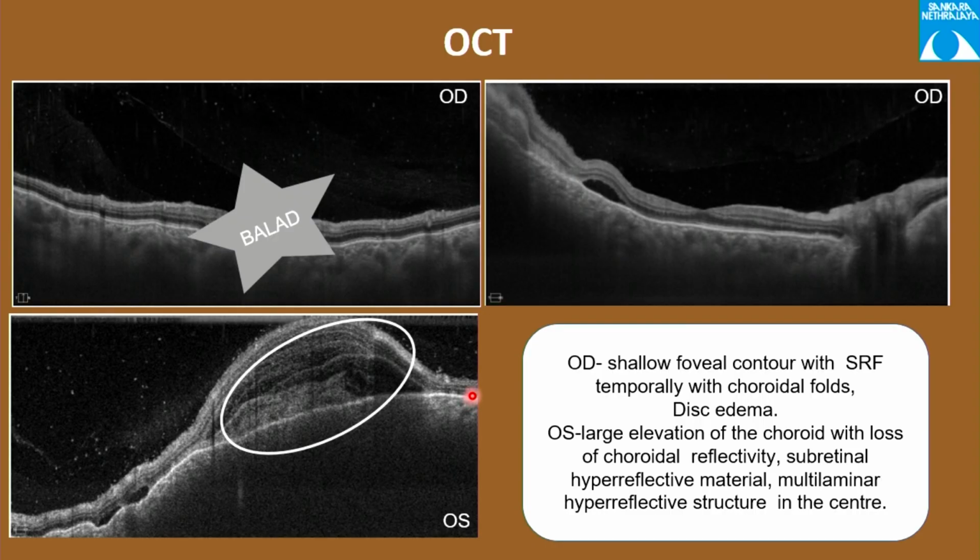Yes, ma'am. So initially I was telling you, whenever you have a choroidal lesion, you can also look at the OCT into the vitreous echo. See how this vitreous is appearing, and also how the neurosensory retina is looking. From that you can get a clue whether you're dealing with an infective inflammatory or an infiltrative pathology. And one more thing I would like to point out: if your neurosensory retina was normal, compact, but you still had this bumpy RPE, or the choroid was undulating like this, one other differential you must think of is a lymphoma, which is a uveal lymphoma.